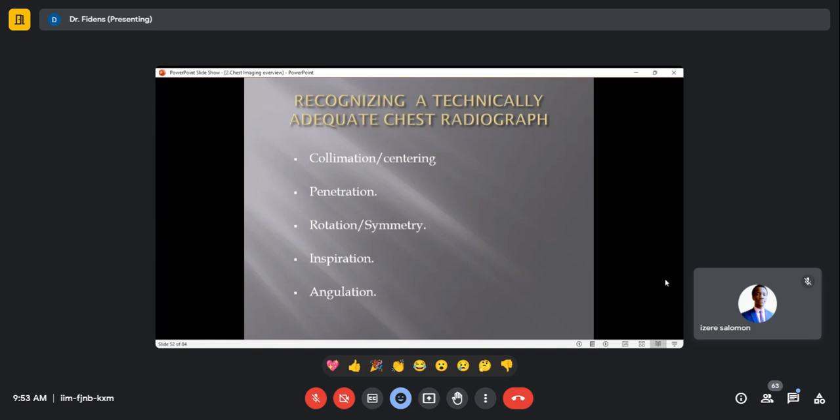But for some patients, like in the ICU, where distance and angulation cannot be measured, that perpendicularity can sometimes be lost. You can't make it. And if you don't make it, the X-ray beam will not come perpendicularly to the chest. What will happen now?